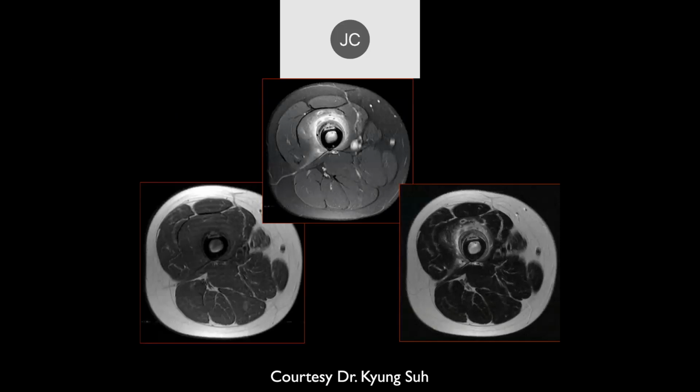So here we see the periosteal reaction, a multiple laminated appearance, typical of infection, but you can also see that kind of an appearance with osteogenic sarcoma. But here we can see a lot of edema in the surrounding soft tissues with what looks like a defect in the cortical bone here, not endosteal scalloping.